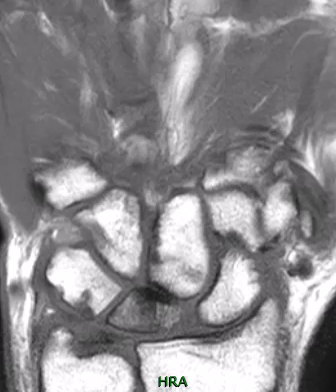This is a patient I had shown earlier on another video. They had a ruptured flexor tendon in their fifth digit, but they also have this entity, which is avascular necrosis of the lunate bone, also called Kienbock disease. Some people call it lunatomalacia, but it's abnormal blood supply to the lunate bone. It gets weak and can collapse or just slowly deform over time.